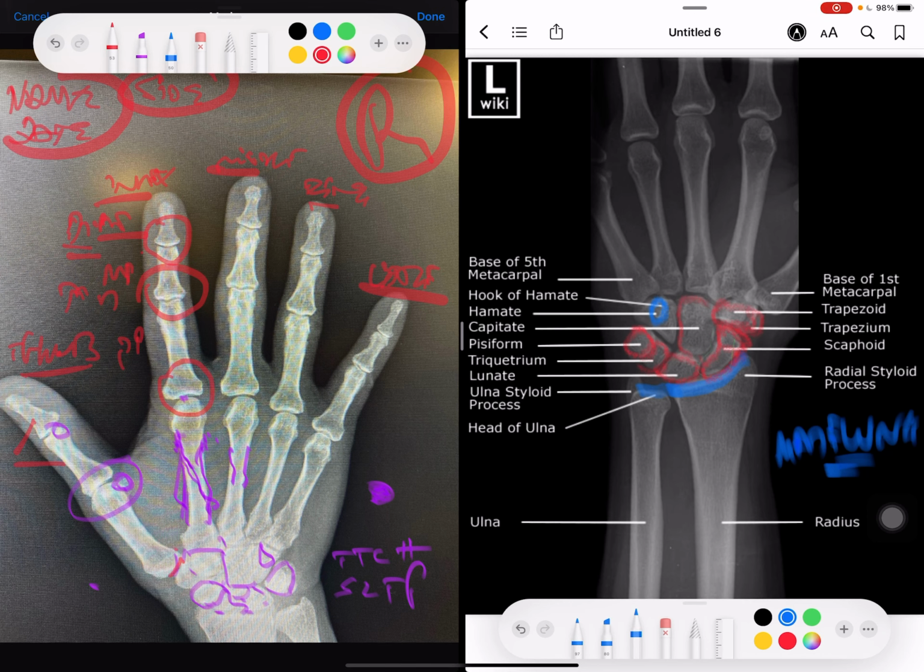Basal arthritis is the most common, especially in women golfers, and we take this bone out here, the trapezium. I had one patient, she does a lot of typing, who had pain in her thumb, and her X-ray showed that these two bones were very calcified, white. They're in contact most of the time.